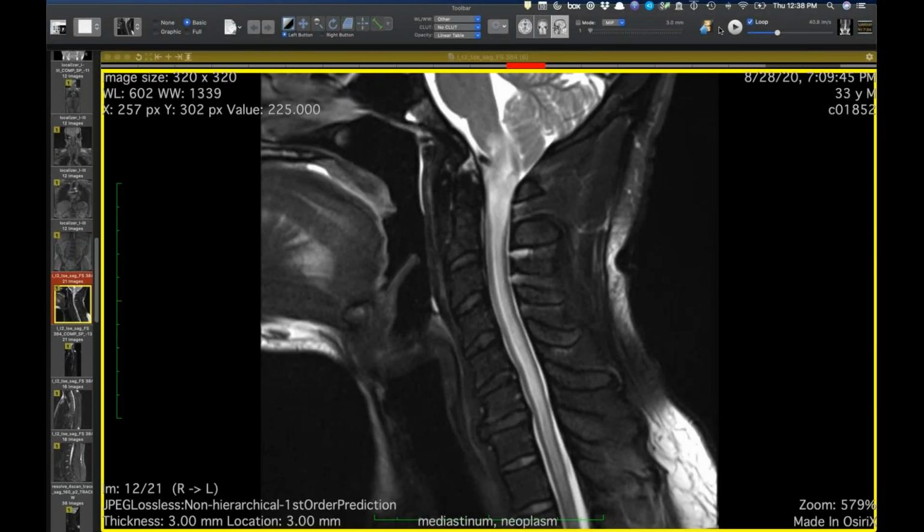And this is an interesting recent case from our VA. This is a man in his 30s, a previously healthy vet who presented with some unilateral weakness, numbness, some ataxia, and some urinary difficulties, and underwent head and C-spine, and well, total spine MR.